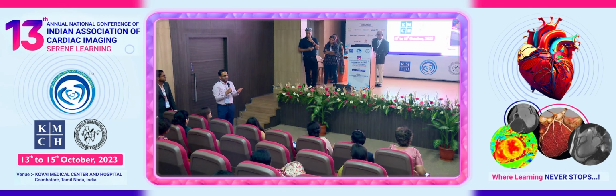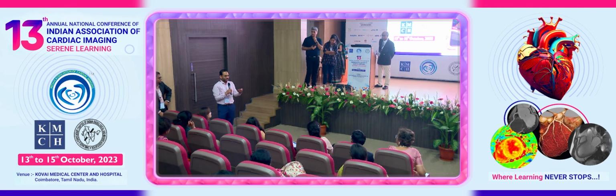Another thing is that people generally mention bridging in the context of other cardiomyopathies. Like bridging is extremely common in patients who have hypertrophic cardiomyopathy. So it is important to know that. And some people say that we should also mention whether the bridge is superficial or deep in the myocardium, which we do.